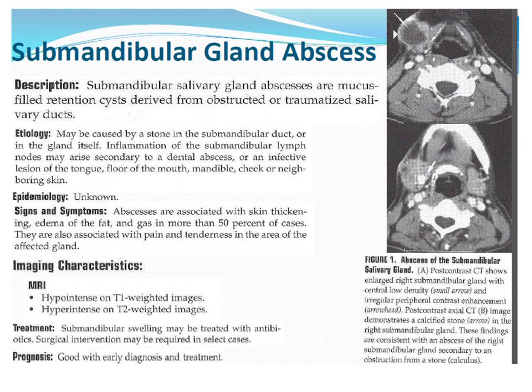This is an abscess within the submandibular gland. Of course, you can get abscesses in many different locations in the neck. So this is just one example. This is the submandibular gland. You can see the normal one over here. This is on CT, but you'll see similar findings on MRI. The one up here has this area of hypodensity, or decreased enhancement, in this case because it's a contrast enhanced study. On an MRI image, this would show up as a fluid signal intensity, T2 bright area, and that's compatible with an abscess.